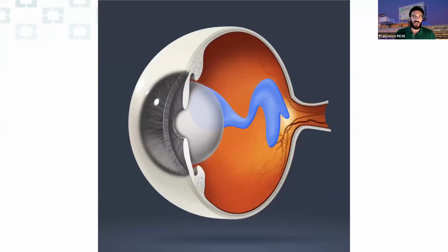So the vitreous, based on the studies done in cadaver eyes and in vivo with OCT, consists of a premacular bursa, an optically empty space in front of the macula, a Cloquet canal in front of the optic nerve, a hyaloid tract of Eisner, which comes from the regression of the hyaloid artery, and the Berger space.